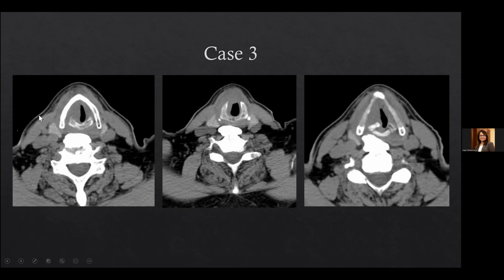So in this case, we have to be very sure. Whenever we look at sclerosis, this is a very important point which we need to emphasize. Now, the thyroid cartilage has a very low specificity for sclerosis, meaning that if there is sclerosis, the specificity of involvement of the thyroid cartilage is very low, around 40 to 50%. So if we see sclerosis of the thyroid cartilage, it may be due to just the inflammatory component of the disease that the cartilage appears sclerosed. So until and unless we see erosion of the thyroid cartilage, whether it is inner cortex, outer cortex, or through and through, we should not say that the thyroid cartilage per se is involved.